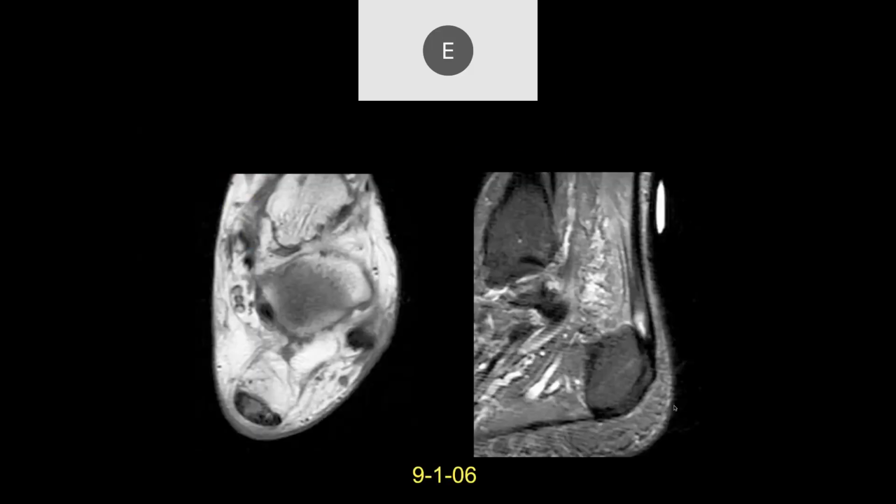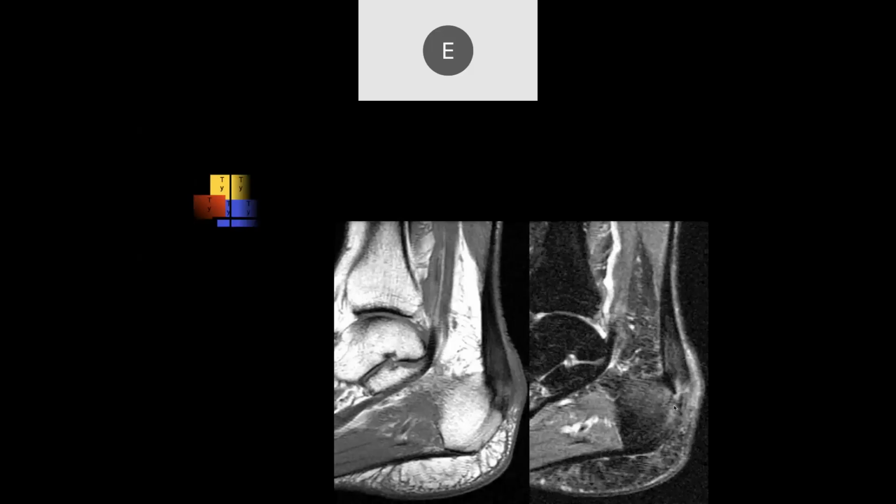So this is a partial insertional tear where the bone is directly involved, as we see there. I'm sorry to interrupt you, John. Go ahead. The ideal treatment of a case like this, or degenerative partial tearing higher up, is to immobilize the patient in a plantar position and let them heal. A lot of people try to treat them with activity, exercise, and passive and active motion, and to me, that just doesn't work out.